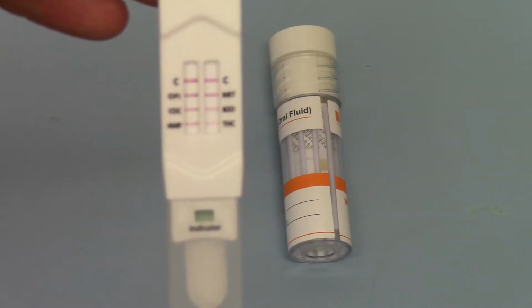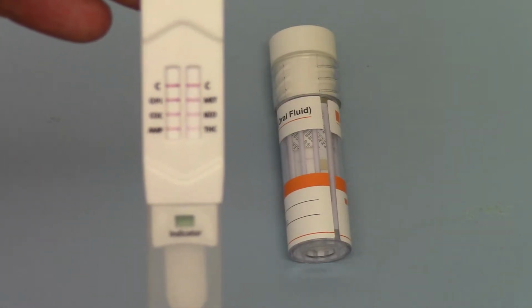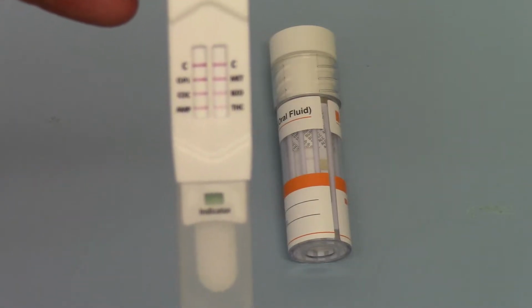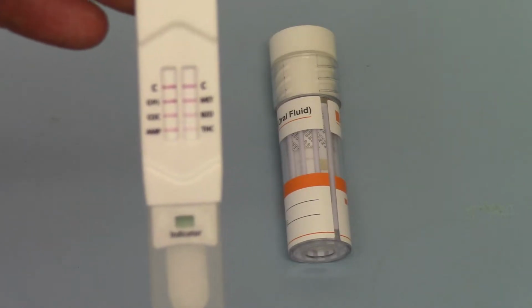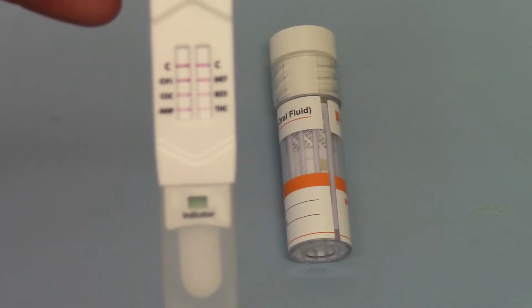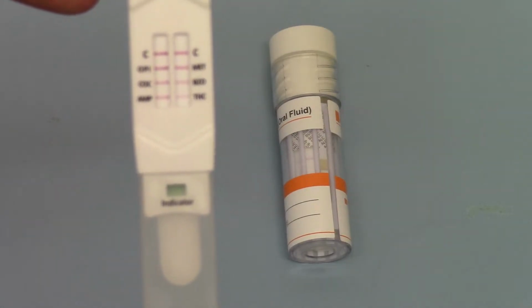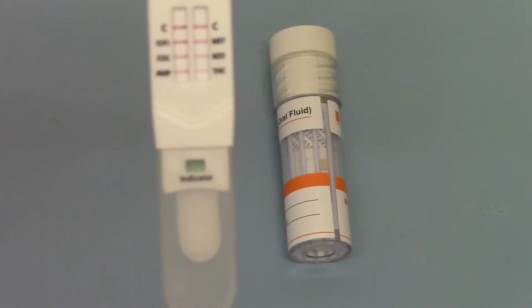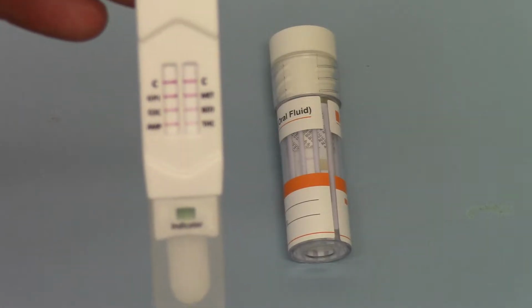You'll see on this particular design you've got two parallel runs of test results with a control line at the far end, and you'll see along these different tests quite a variation in the colour density, thickness and saturation of the test lines. These are all negative results for all 6 drug groups. They're abbreviated to the MET, BZO, THC on the right hand column, and OPI, cocaine, and amphetamine. OPI is the opiate test membrane.